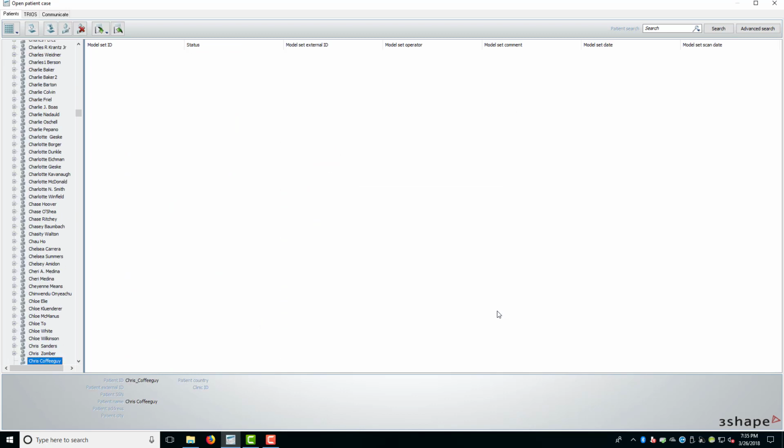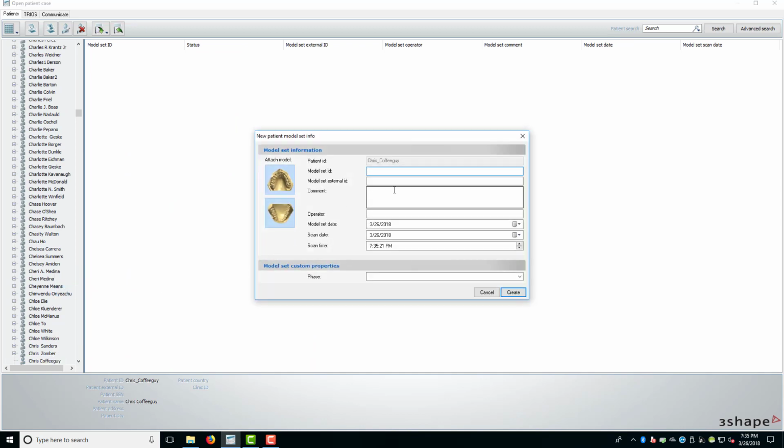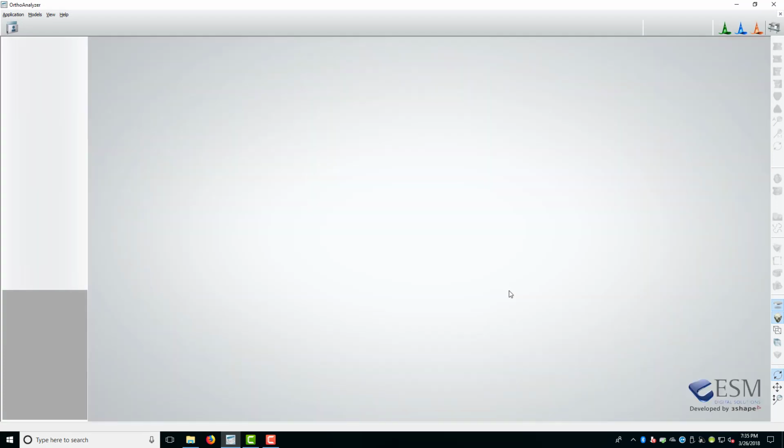So I created that. I got to come down here. I got to create a new model set. I'll make the model set ID my birthday. I am now 47. You can all wish me a happy birthday. And create that. And then it brings me to the import screen.